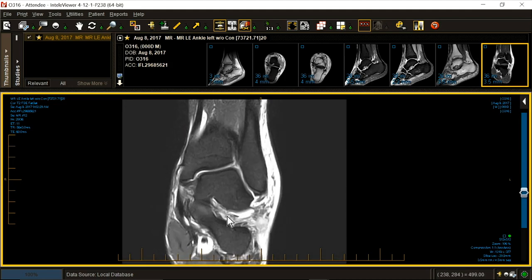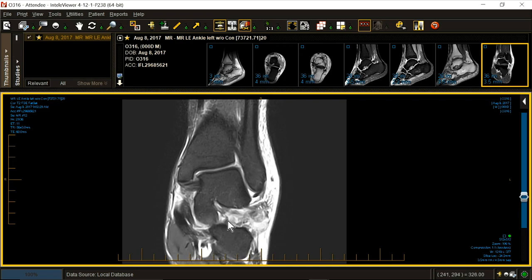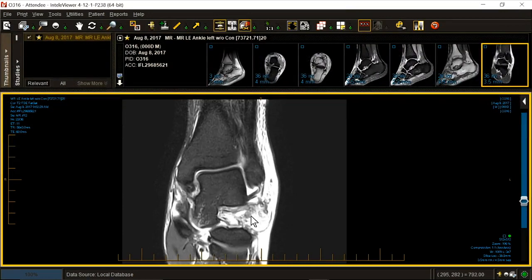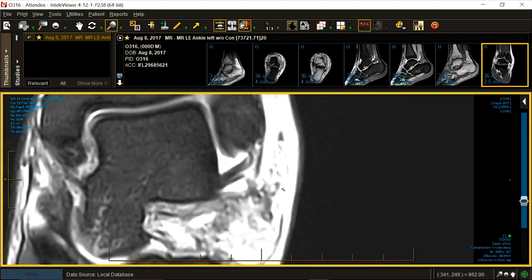What about our talocalcaneal interosseous ligament, which sits right here? Torn. What about our straight celery stalk cervical ligament that sits right here? Torn. What about our frondiform ligament, also known as the stem ligament, the deep portion of the extensor retinaculum? It looks like a kangaroo. Can you see it? There's the eye, there's an ear, there's the nose. It's a kangaroo.